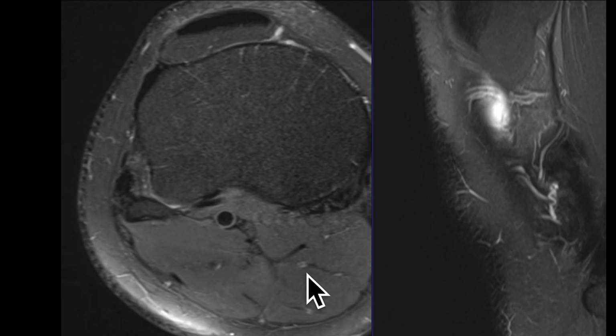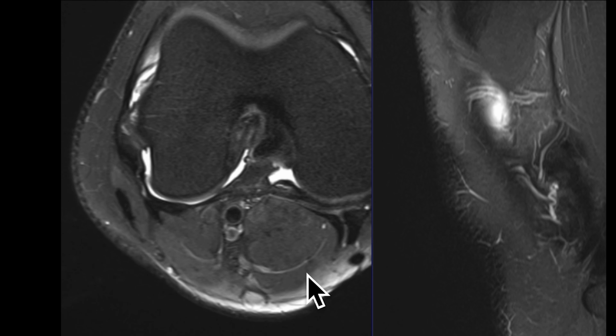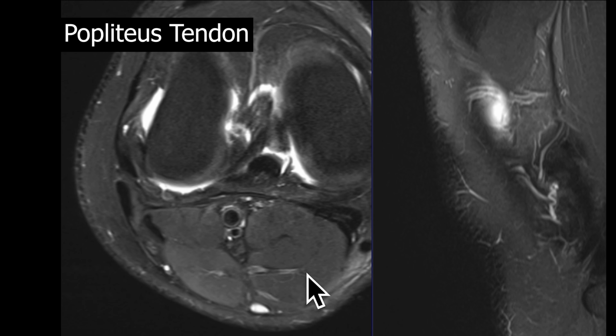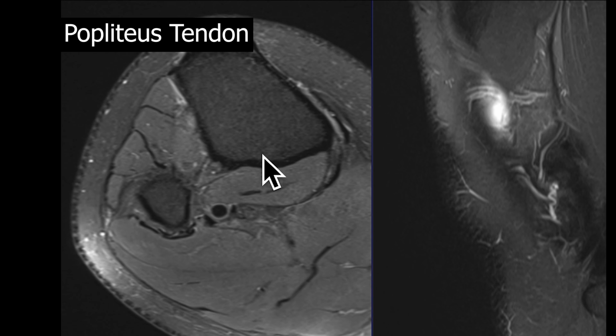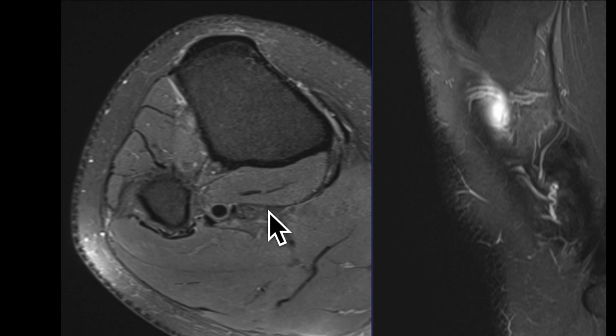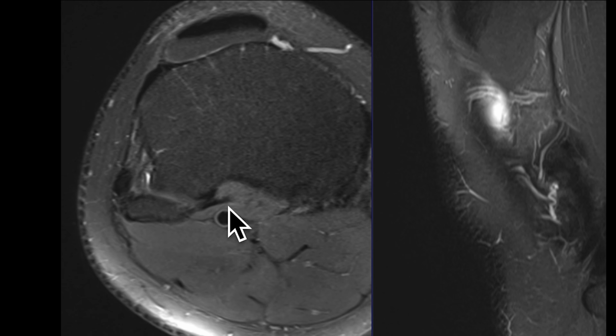The third main component of the lateral collateral ligament complex or posterolateral corner is going to be the popliteus tendon. So the popliteus muscle belly forms part of the deep posterior compartment musculature, and you can see it here rising from the tibia. And then this is a muscle belly here, and centrally here we have the tendon. So now we're in the proximal third of the calf and we're going to head back towards the knee, following this structure here, which is a popliteal tendon.